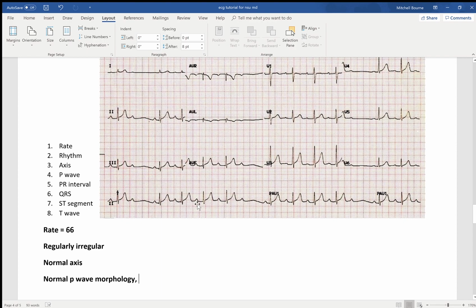This one looks about the same, or maybe a little bit longer. This is a little bit longer. And then we have a P wave, no QRS, and then a pause. And then it restarts. P wave, increasing PR, increasing PR, P, no QRS. And then it keeps resetting itself.